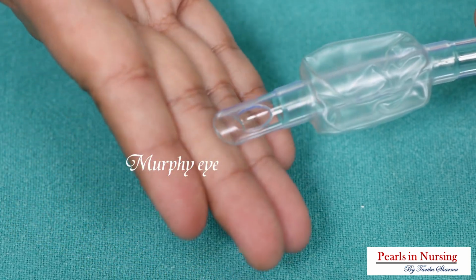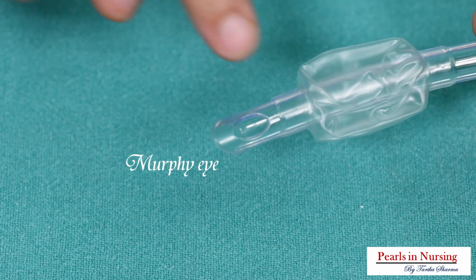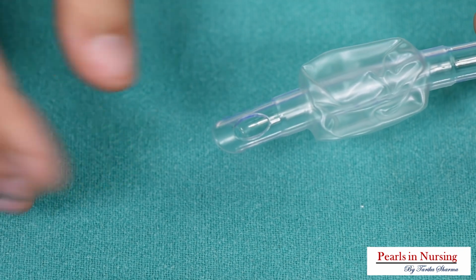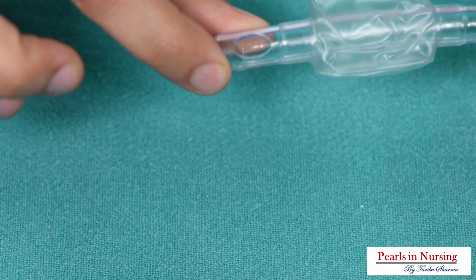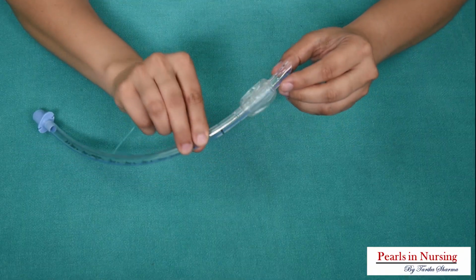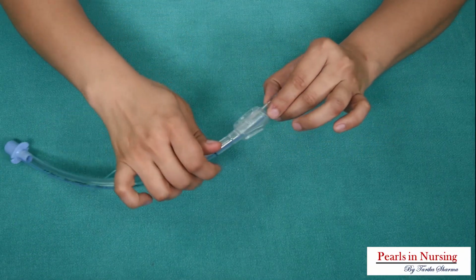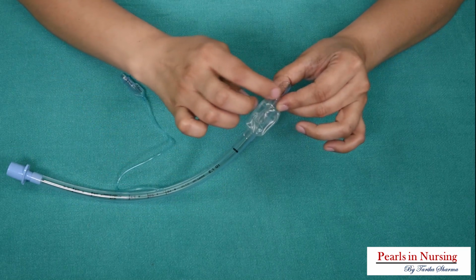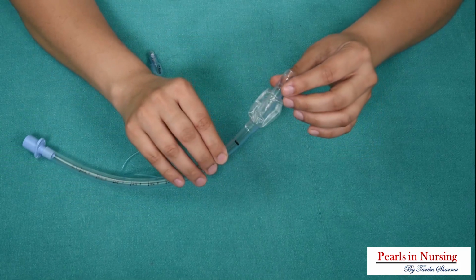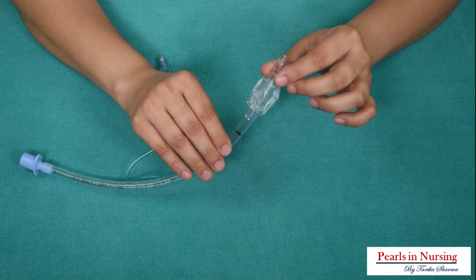Why Murphy's eye? Because we had Dr. Murphy who had given 9 characteristics of ideal tracheal tube and one of that characteristic was having a Murphy eye. So what will this do? By the way, if there is any kind of obstruction here, the oxygen can be passed from this tube also. And there will not be deprivation of the oxygen. So this will be a kind of life saving for the person.